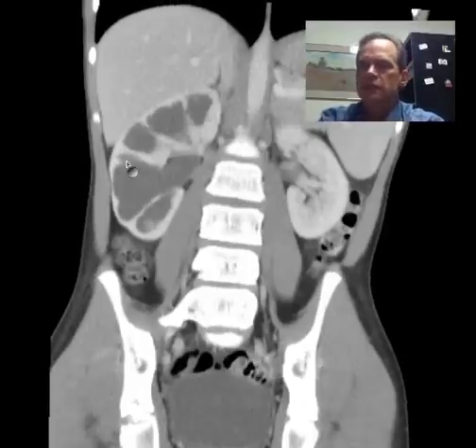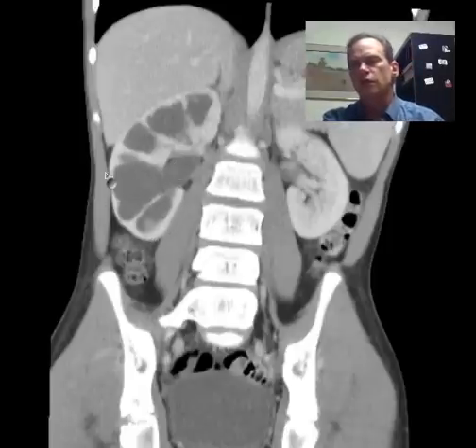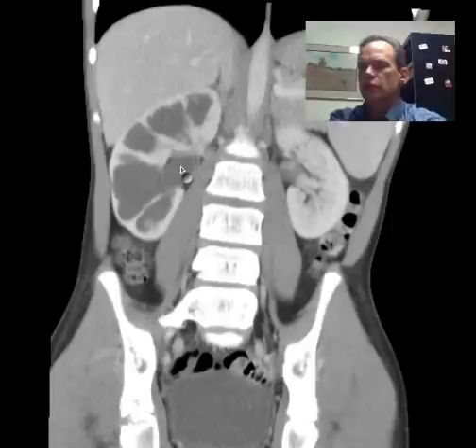So this kidney has acclimated to this long-standing obstruction, and even though the collecting system has dilated, the pressure of the renal dynamics filtering the blood and producing urine, that kind of pressure in toward the collecting system, which initially met a great deal of opposition, now has balanced out over the years.